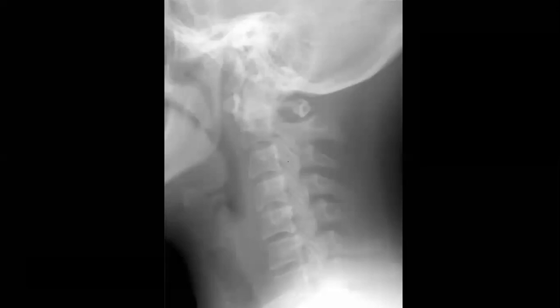One of the very important things is that you can have a checklist. What is the checklist? You have items that you go through one by one to exclude any abnormality. For example, you check the alignment, and the alignment includes all the lines of the spine. So you go line by line to check if there is any misalignment, and you measure, or at least check the measurement of the prevertebral space and some measurement here between the opisthion and the anterior part of the foramen. Exactly. So Dr. Shireen, she goes to atlantoaxial subluxation.